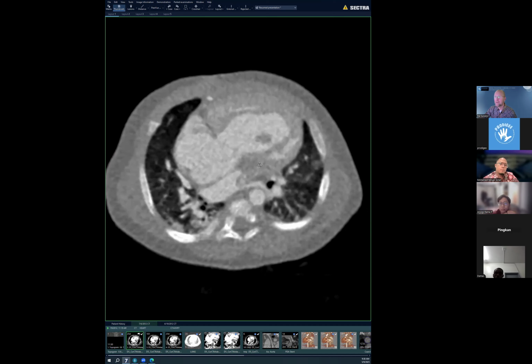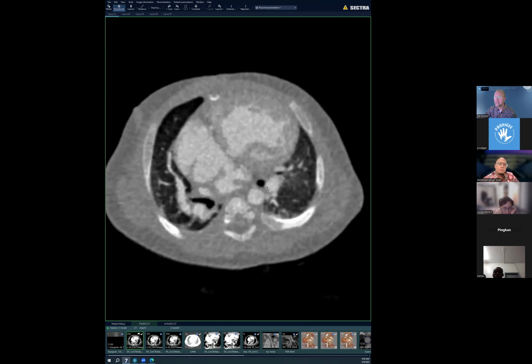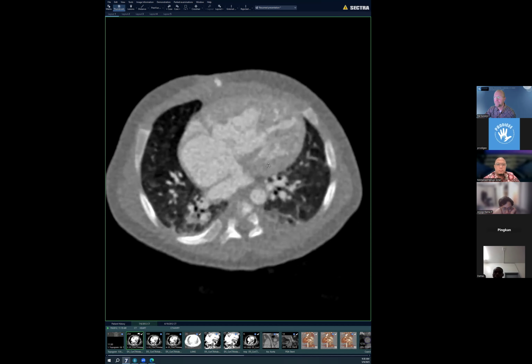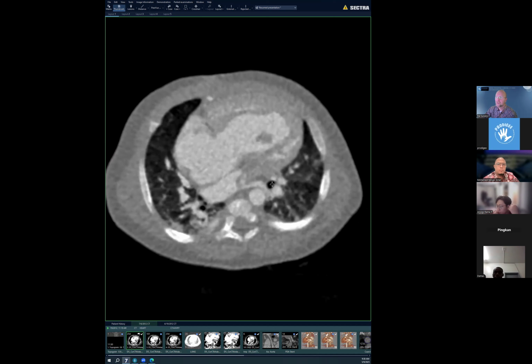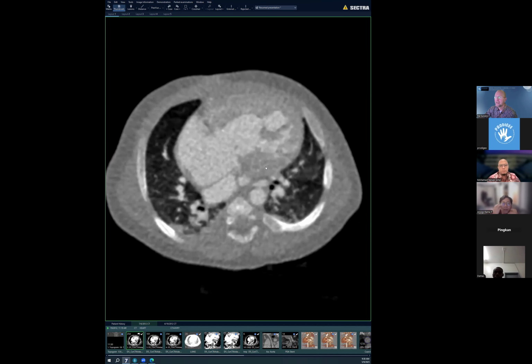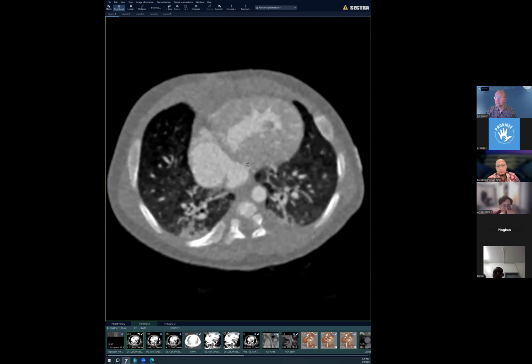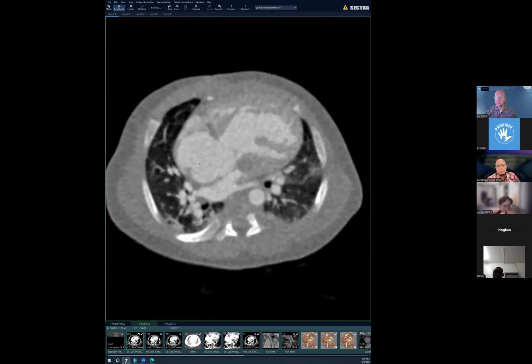as you can see, we have a hypoplastic left heart. I believe the inciting event was aortic atresia. And if there's no flow, it won't grow. So since there was not a lot of flow to the left side of the heart, the left ventricle did not develop. You can even see that the left atrium is sort of hypoplastic, relatively small when compared to the right ventricle.